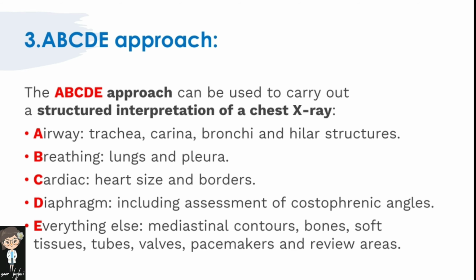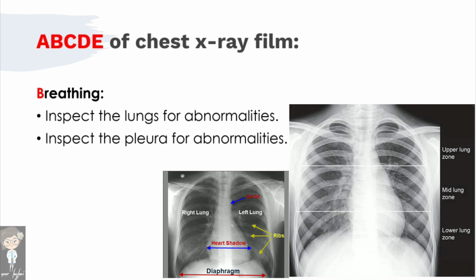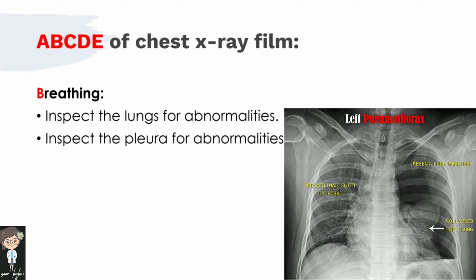Some asymmetry is normal and can be caused by anatomical structures like the heart, stomach, and liver lobe. Increased airspace shadowing in a given area of the lung field may indicate pathology like consolidation or malignant lesions. Complete absence of lung markings should raise suspicion of pneumothorax.